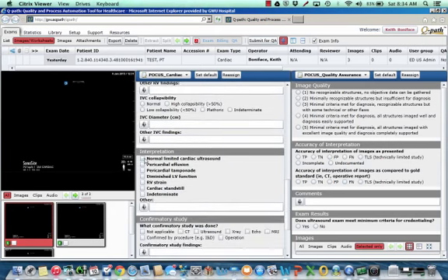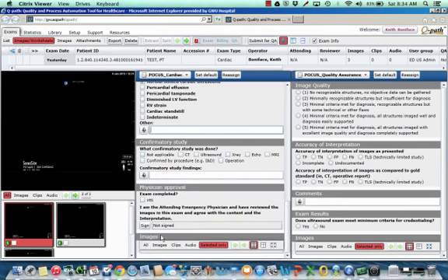And then your interpretation. Is it normal? You can put any other notations, anything else that you find. If there is a confirmatory study that you're doing, a comprehensive imaging test of some sort, a cardiac echo, click it here. If you know the results, type it in. If you don't, that's okay. And then, importantly, you have to click this button here.